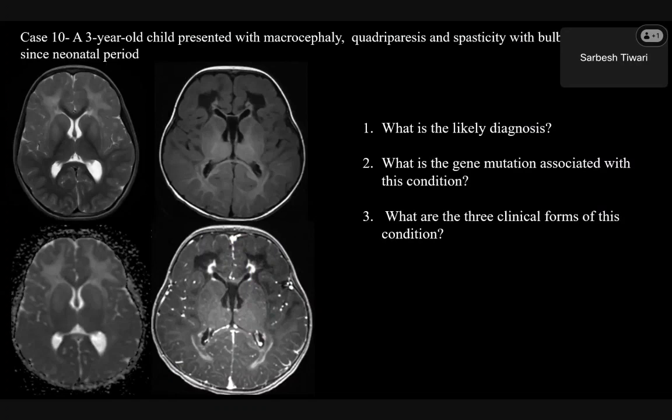So in this particular case also you see the basal ganglia is symmetrically involved, and there is contrast enhancement in the periventricular white matter. In adults, you will see that there is gross atrophy of the brainstem. So in adults, you will not get the classical frontal dominant appearance. Rather, you will see involvement of the brainstem. You see that there is significant atrophy of the brainstem, and this has been described as the tadpole sign. So if you see gross atrophy of the medulla and the cervicomedullary junction, do keep a differential diagnosis of adult onset Alexander disease in your list.